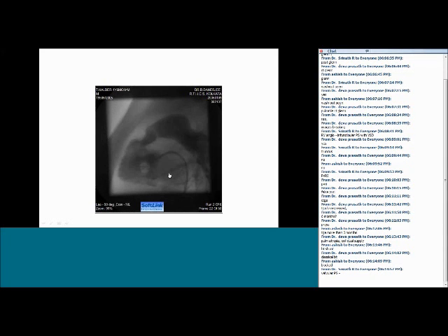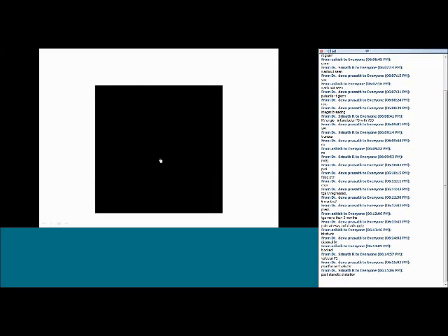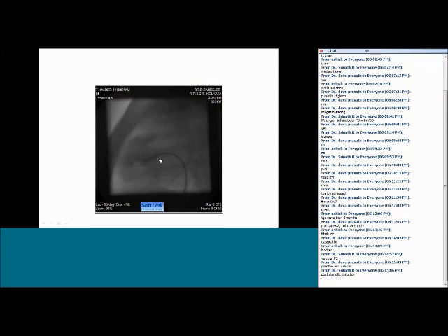It is a lateral injection. Yeah, valvular PS is very right. There is a doming pulmonary valve, but there is also an infundibular component with the post-stenotic dilatation. So all of you are right partially, but everyone has given one part of the answer. Srinath, Devaprasad, and again Srinath. So it is basically valvular pulmonary stenosis with some infundibular component, with a doming pulmonary valve with post-stenotic dilatation.